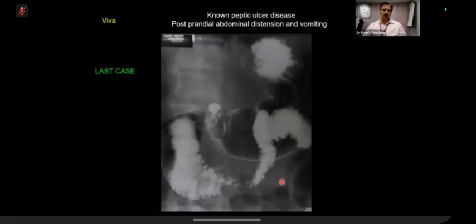This is the last case of the chapter, and over to you. We know that there is a projecting ulcer here, so I know it. I am not worried about it.